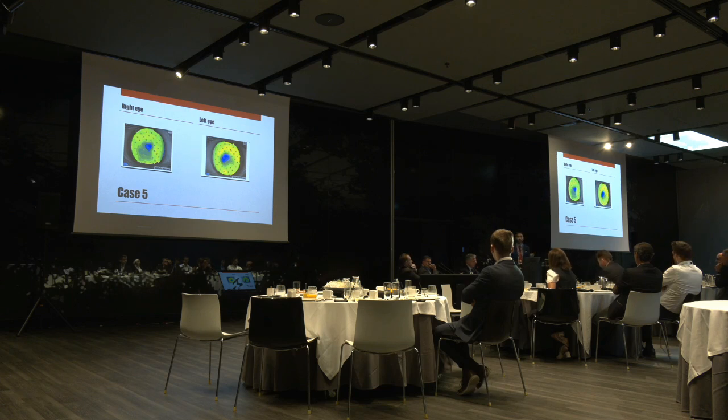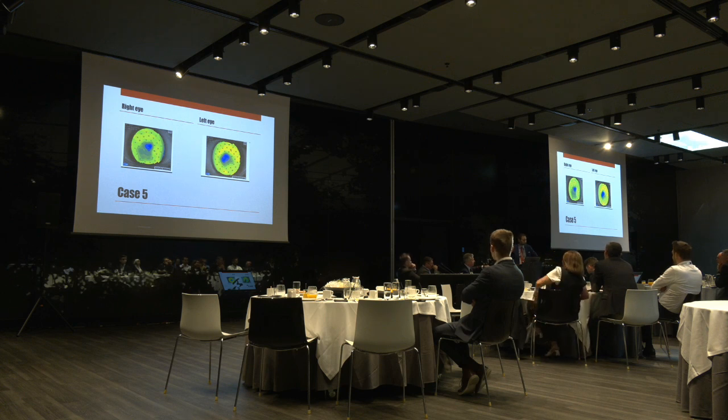Like 8 years before. Wait a minute. One eye. Only one eye. Which eye was cross-linked? That's a big question. I think it's the right one. Yeah, I think it's the right.